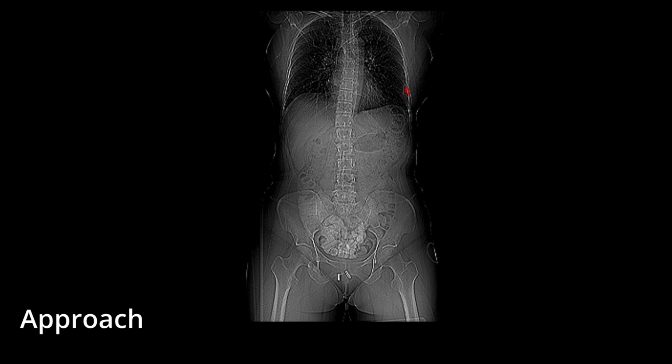Now we will be discussing the approach to reading a chest CT scan. The first thing to look for is the scout image, because the scout image sometimes includes structures that are not part of the entire CT scan. So at the edges of the exam, sometimes a lower neck is included more than usual, or the abdomen is included on the scout images, and there might be a finding that may be pertinent for that particular patient. So scout images are the place to start.